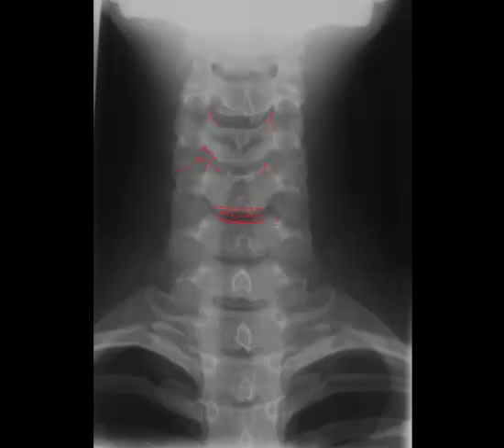The pedicles are these very dense circular-like structures. Remember, they extend posterolaterally off the vertebral body. The next structure we're going to visualize is the articular pillars. Now, everything lateral to the pedicles and to the body is going to be articular pillar. This whole linear region of osseous structure is the articular pillars of each cervical vertebrae.